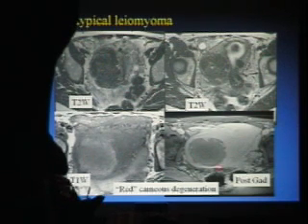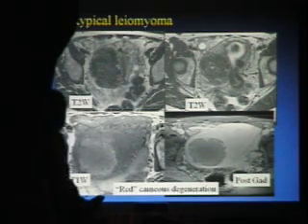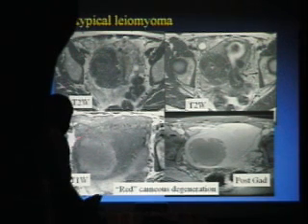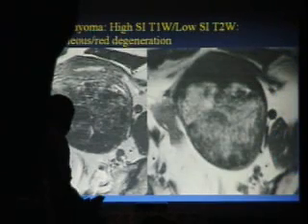This, by the way, is the appearance you see very frequently after uterine artery embolization in someone who had a very viable, perfused one initially. So this is the appearance that you'll see of that hemorrhagic infarction in the post-UAE setting, which you will see more and more referrals for because they do or do not respond initially, and they can have a larger mass effect. They can persist with their symptoms if the hemorrhage is not resorbed and the fibroid doesn't shrink. So this is an appearance to be aware of and to remember in the post-UAE.